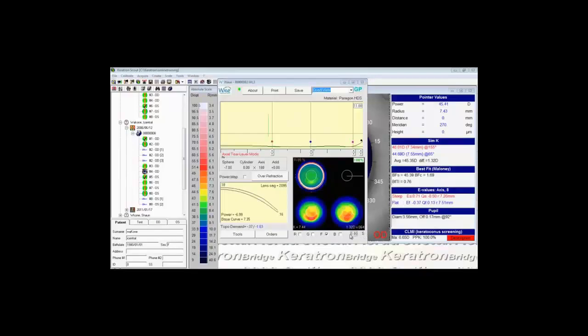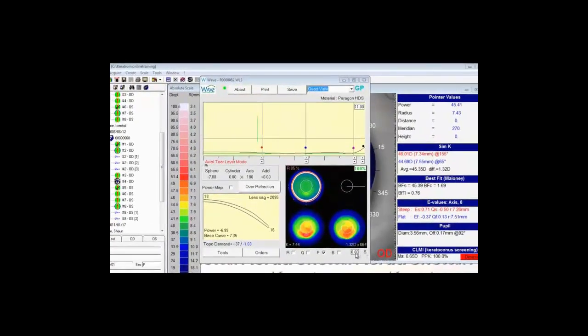And the final box down here is shape factor, which will dictate how much asphericity is in the optic zone. When it's at 0, our optic zone, which is everything from the inside of this red control point, is a spherical or single cut curvature. If we add asphericity, then it's going to be an aspheric curve. To better explain that, I'm going to take this lens and open up the optic zone very wide, and you'll see how that completely changed the back curvature of the lens design.